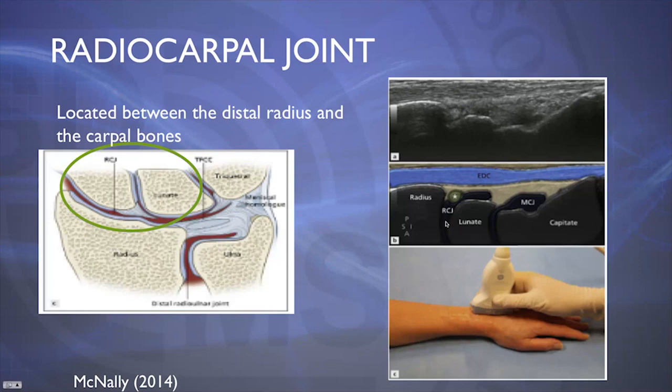And then I'm getting ahead of myself on one slide, but you can see the mid-carpal joint is located here between the lunate and the capitate. And in this diagram, it shows it nicely too. So the probe is positioned in this area here, again between the radius and the lunate, right in this region. If fluid is located here, you'll be able to most likely see it extending across this kind of joint space area, so you'll want to evaluate the fluid in its entirety.